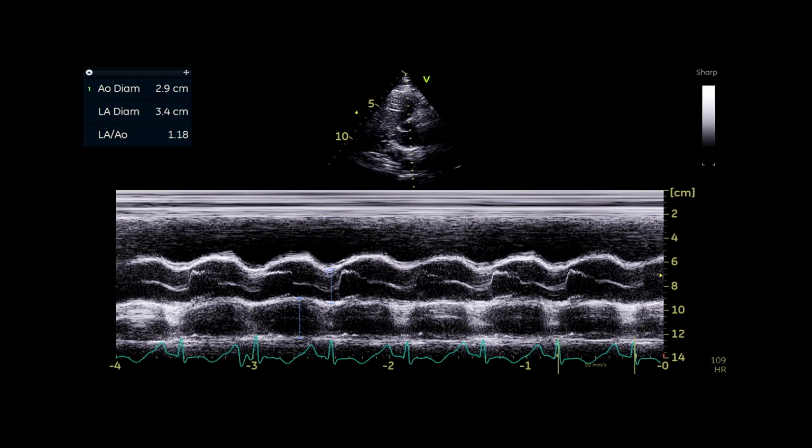I just kept this slide to show that you can see the aortic valve systolic spectrum is not box shaped as we usually get in normal subjects. It kind of tapers down towards the end systole. This is perhaps because of compromise in left ventricular contractility or left ventricular ejection at the later phase of systole, subject to the disease the patient has come in with.